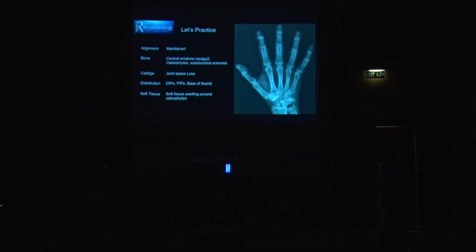Okay, now, any questions about reading the X-ray? So the ABCD approach: alignment, then B, the bone. You look at the outline, whether it's continuous and sharp, and then you look at the bone itself. Is any bone missing, is any extra bone there? You look at the mineralization, you look at the texture of the bone. And then you look at the joint space, which is the cartilage, if it's normal, reduced, or increased. As I said, increased is not common, it only happens in acromegaly. And then you look at the distribution of the regions and if there are any soft tissue abnormalities. Right? So, for example, if we take this case, you see the alignment.